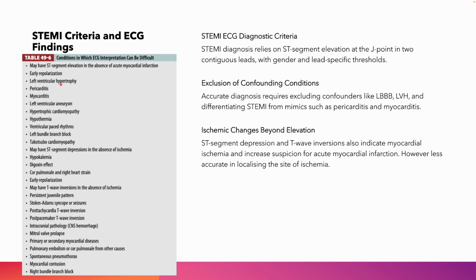So basically any damage, any change to the velocity of the myocardium in electrical impulses can cause this. So it's important to note these conditions. I'm not gonna say them all, but take a look at them and put them in mind, because they could mask an acute myocardial infarction, or perhaps cause a false positive.